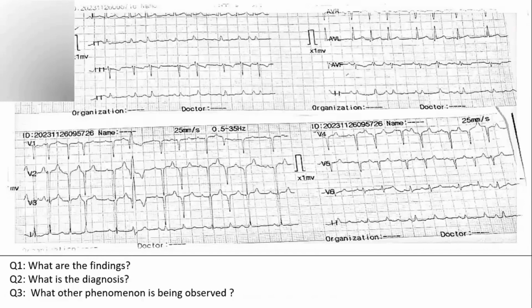The findings are definitely that there is some tachycardia. You can write SVT at your level. There are 3 types of SVTs: AVNRT, AVRT, and atrial tachycardia. But over here, they are giving you some hints. AVRT is definitely ruled out, as we discussed in the previous lecture. The AVRT circuit doesn't fit in over here. So the other possibilities are AVNRT and atrial tachycardia.